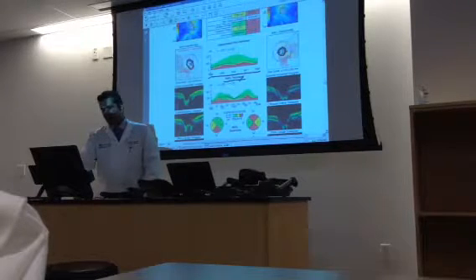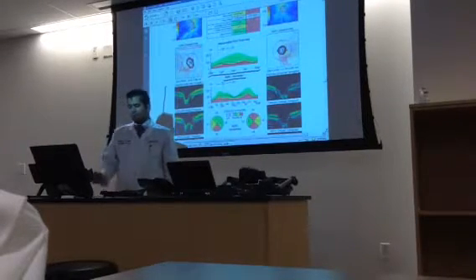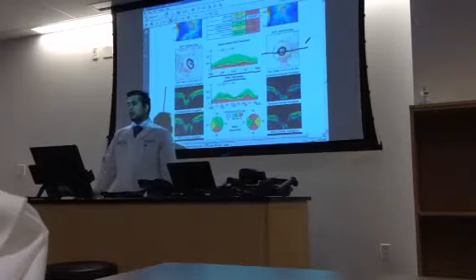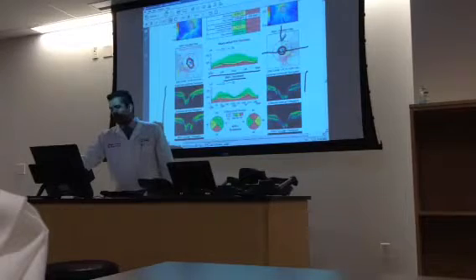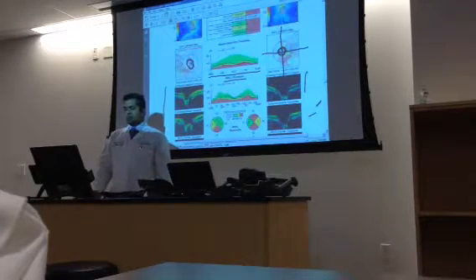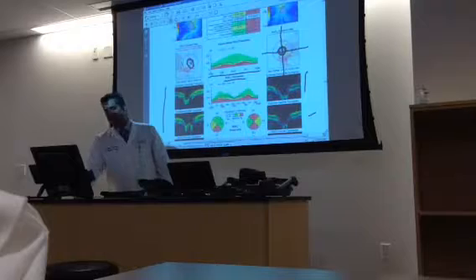Nerve fiber layer thickness, right eye and left eye is compared to each other, and the more similar they are, the better it is. This is the horizontal tomogram and the vertical tomogram. What are they? Well, a horizontal tomogram is one line scan along the horizontal cut of your OCT, and that's right here. A vertical tomogram is a vertical cut in your OCT, which is right there. These are not very helpful for glaucoma per se. You don't make any major diagnosis from this, other than the fact that it sort of gives you an idea how deep the cup is, how wide the cup is.